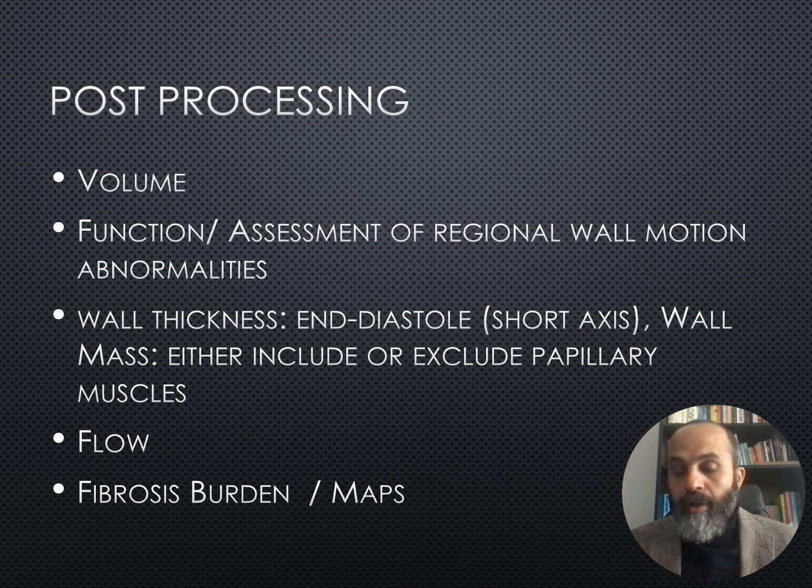And always believe your eyes. Post-processing should help what you are viewing on the images. It's common knowledge that cardiologists and surgeons know how to check the scans by themselves. So it's important that what you see matches what you get from the software. If there is a discrepancy, then always check your contouring and check the numbers coming from the software for any mistakes, and always believe your eyes. If the image is telling you it's an impaired ventricle, it is an impaired ventricle. So always train your eye on eyeballing.